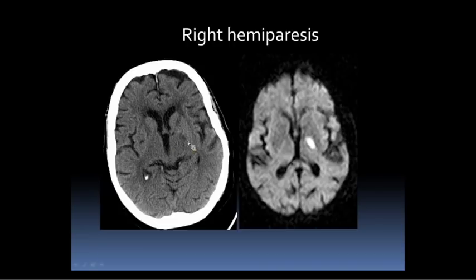But we know that in terms of lacunar infarcts, this is age indeterminate because it's not dark, it doesn't approach CSF like this one over here. So you have to have a high index of suspicion, know the location that you're looking for, and say, okay, this right here is a little suspicious. It could not be an infarct, but it certainly could be an infarct. So if it correlates with the clinical symptoms, think about it being an acute infarct and get an MRI.